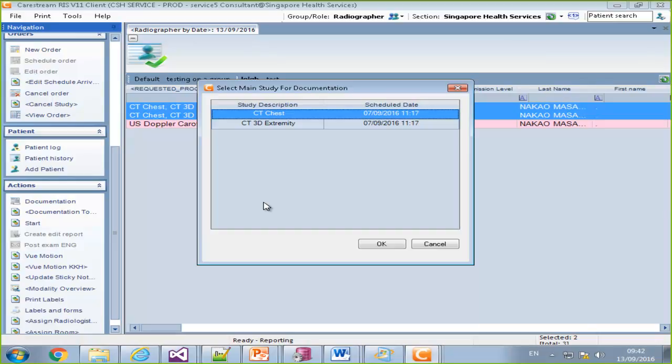The important thing, and I will show it to you later, is that when we're about to document new studies, there is an option like we had in the original documentation context aware form to add a study. And when we are here, we have the ability to add more than one study. And then we have, as Dina said, several documentation together groups. So basically we can add something like 5 or 6 studies and document them together. And they will belong to different groups, so will be opened in different windows. Dina will talk about it soon.